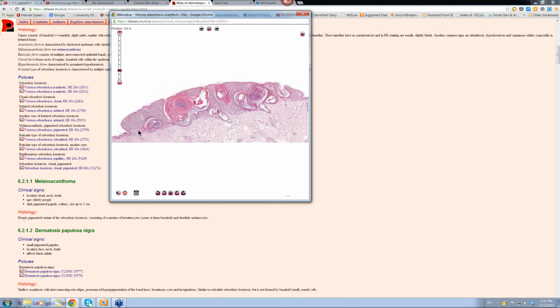Look at the way this is just stuck on the epidermis. Okay, there's your edges there. It's just stuck on. You take a piece of string across here, and all the lesion would be above it. Some of these, this is keratin-lined cysts, and these open out into the surface here. They're not true cysts because of the openings that they have. Some of these will appear white. Some, if they're close to the surface like this, will appear brown or orange with the keratin in them. So this corresponds to those orange and brown clods that we saw earlier on.